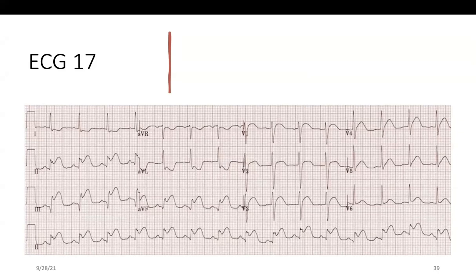Again, start from lead 1. What do we have? Where are the most prominent changes? 2, 3, and AVF ST elevation. Excellent. ST depression in 1 and AVL.